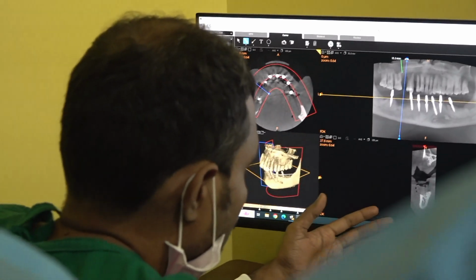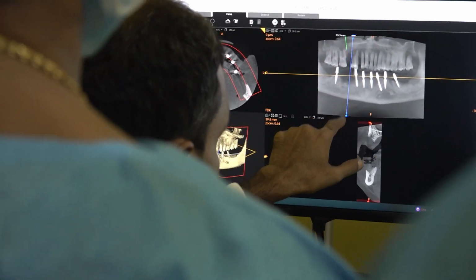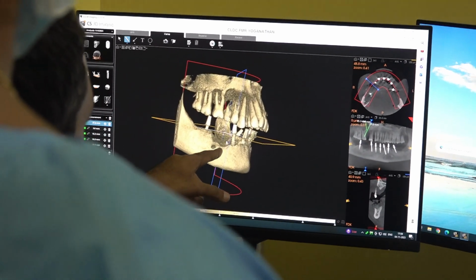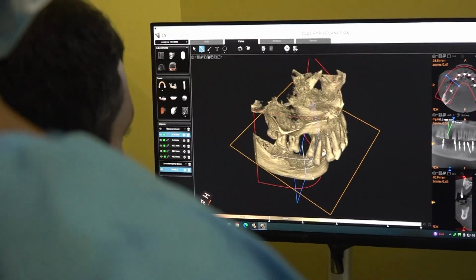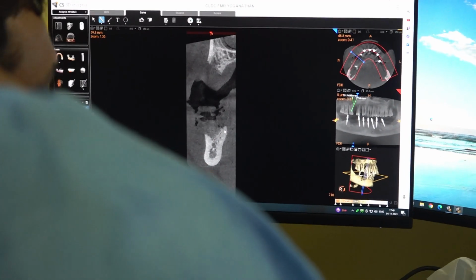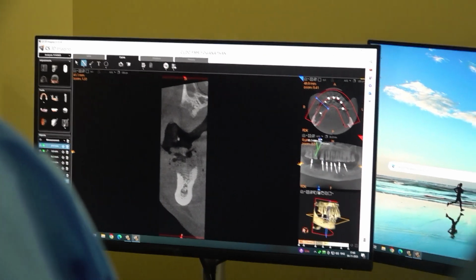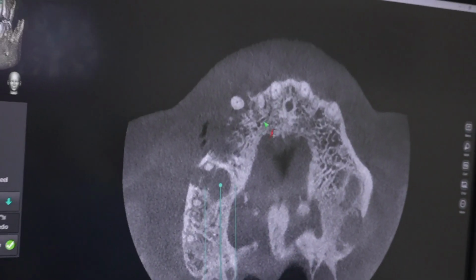What I was thinking is, see, this is the mental foramen, right? Behind this there is good bone. Behind this implant, we can place one more implant actually. No, this is the mental foramen. Here it is safe, but the foramen is very close, sir. Yes, so we can place one implant. BCs we have to place because lingually it is higher. So this is the mental foramen, right? Okay, we will place one small BC. Alright, no?